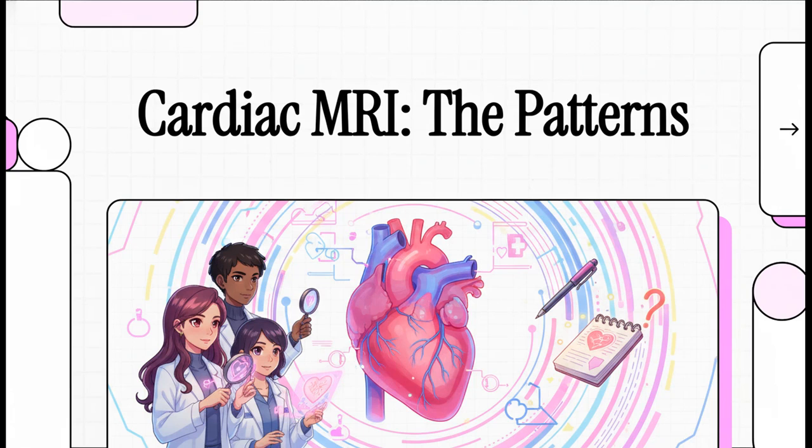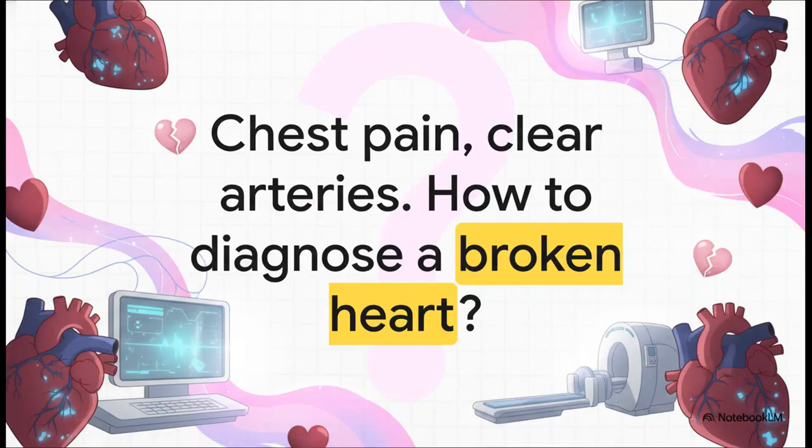All right, let's jump right in. Today, we're putting on our detective hats. We're going to look deep inside a beating heart to solve some of its most complex puzzles, and our main tool is the incredible power of cardiac MRI.